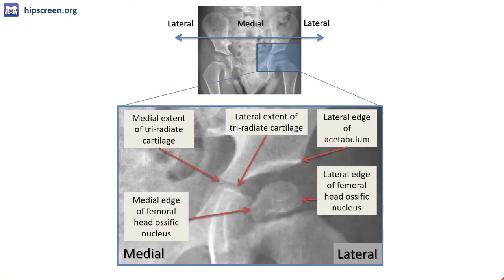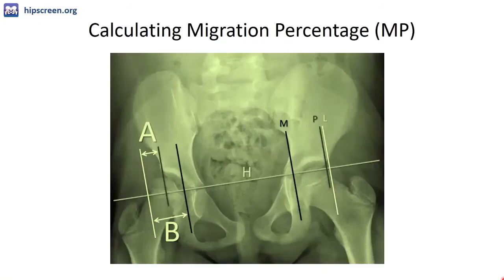This relative terminology becomes important when we're starting to use some of the landmarks for measuring the migration percentage. So let's get into it. Now that we've gone over the language of radiology, we can now begin starting to calculate the migration percentage.